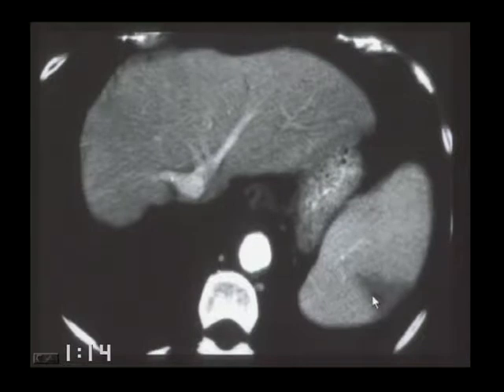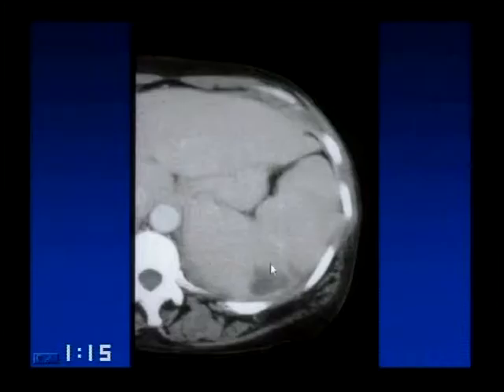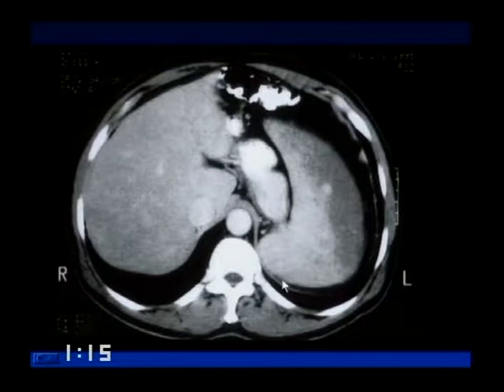And they may stay there forever, or they may heal. Most heal, but when you see it and it's wedge-shaped, it's an infarct. They can be multifocal. This patient has myeloproliferative disorders, multiple wedge-shaped foci. These are also infarcts.